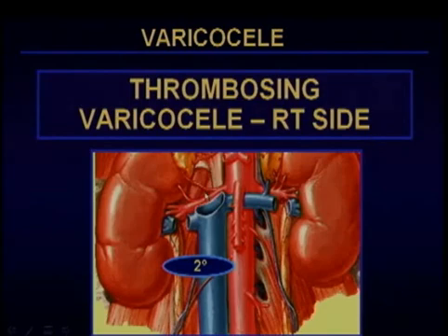Whenever you see a new varicocele, particularly on the right side, you know, this shouldn't happen. You shouldn't have varicoceles on the right very commonly because it's easy to negotiate the flow from the right into the inferior vena cava.